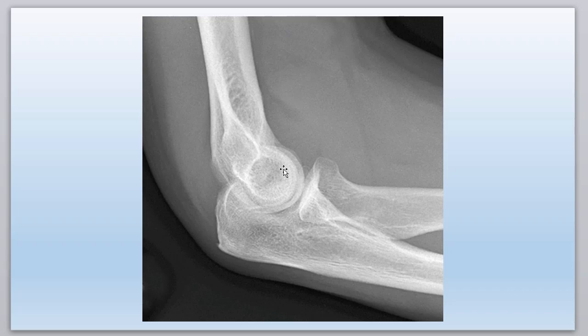And so I'm looking at, there's the capitulum, the trochlea is outside of this through here. I don't see any fractures there. This looks a little funky though, doesn't it? Right? So the elbow's rotated in this, right? Because now we got, what's that bump? Radial tuberosity's down here on this image. So the elbow's not a perfect X-ray.